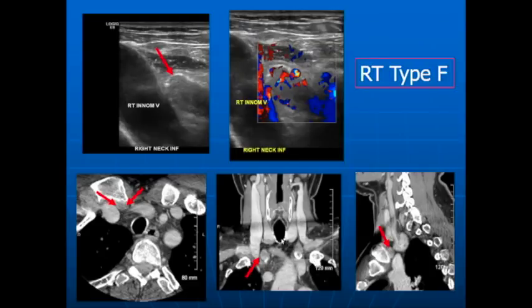Here are a few examples. Here you can see by ultrasound, it's possible to see some of these glands that follow the gland into the thyrothymic ligament region. This is an ultrasound. You can see this is the gland. This is the right innominate. Here you can see the vascularity, the polar branch here. And look at the location, just posterior to the head of the clavicle. Here you see the normal side in relation with these vessels.